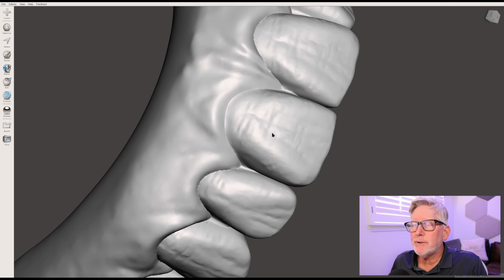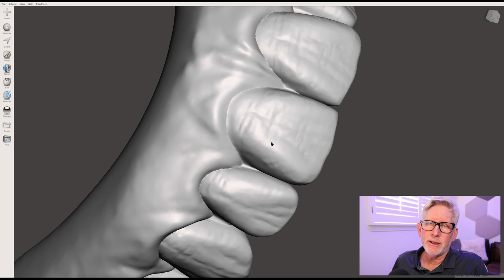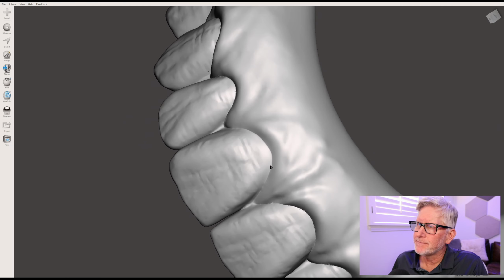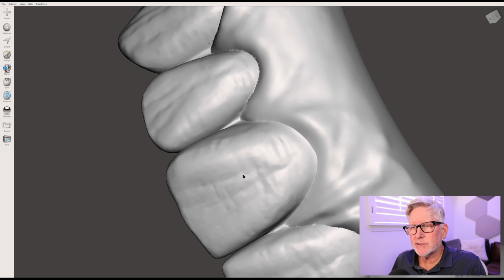Another really popular program today that's coming on board is Blender for Dental. Blender is a really powerful program. It's very difficult to learn from the start. But once you pick and choose some of the things that can benefit you, it really makes a huge difference. But as it relates to this today, it's just one quick little tip to utilize two tools inside MESHMIXER that can make a real difference in your patterns.